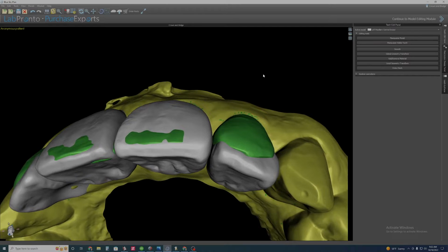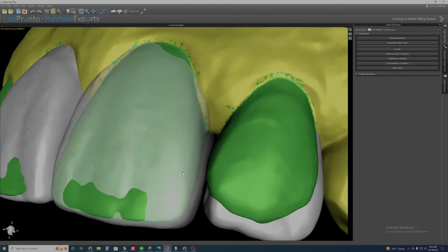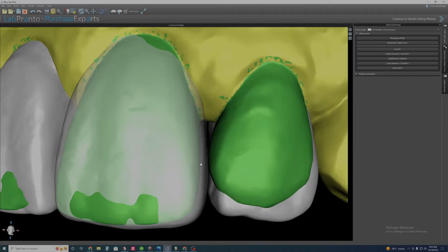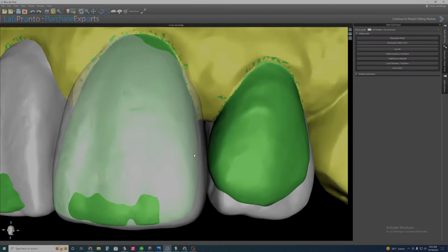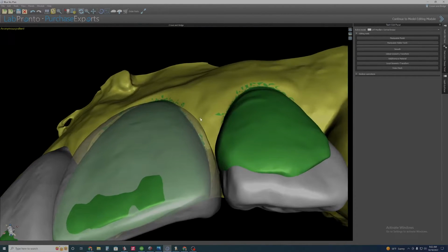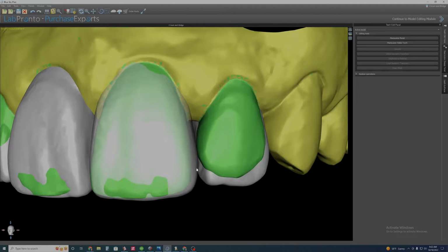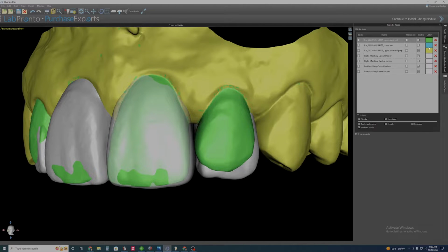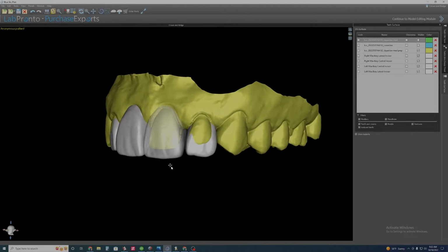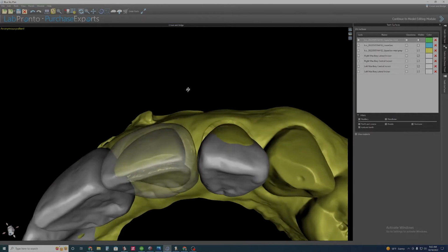And now I'm just trying to see where, so this tooth is expanded way farther distal. My wax up is compared to the natural tooth, which is fine. Obviously we need to close up these spaces, but it's probably a little more so than I hope. But again, everything has to be done in relation to one another and kind of more proper ratios, and these teeth are designed with pretty good ratios already considered.